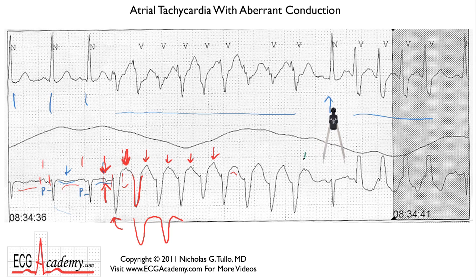Because this P wave blocked in the AV node. You had a second degree AV block that occurred right there. So this P conducted to the QRS, but this P blocked. Now you have the pause that refreshes, and the bundle branches recover. This P now conducts with a fairly normal PR interval down the bundle branches that are both capable of conducting.